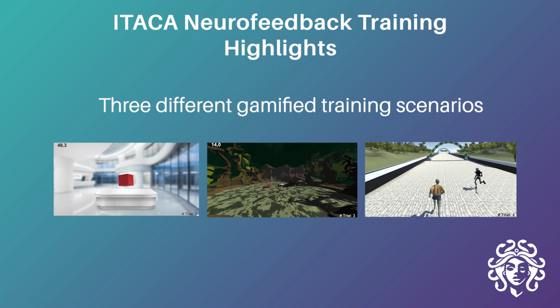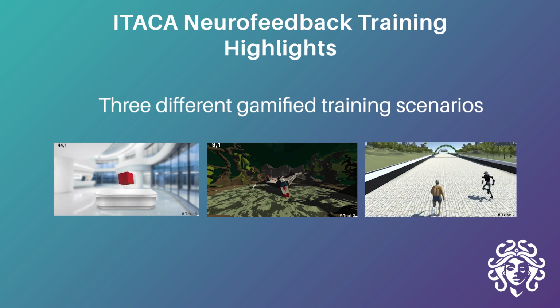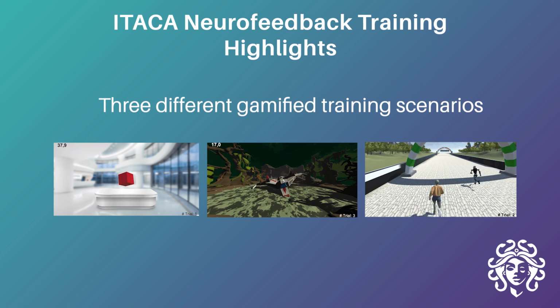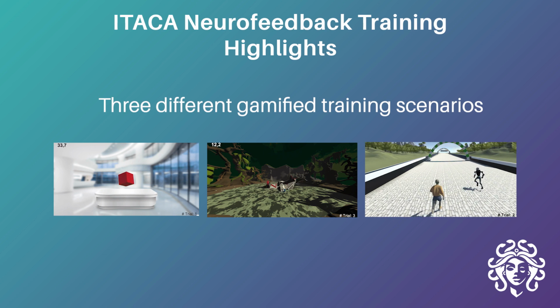Secondly, ITACA offers 3 different training scenarios, each with a different gamified design and different objectives. This makes it possible to combine them in your experimental protocols to adjust the difficulty of the session to the user's performance, and avoid the demotivation due to tedious repetition of the same training scenario.